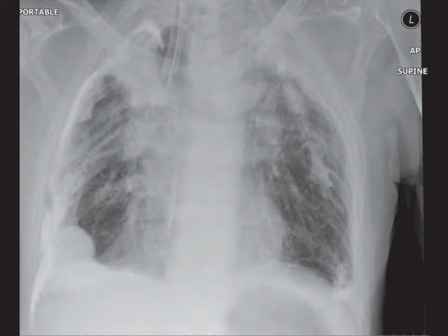Today, we're examining a rotated mobile supine radiograph of an adult patient. The patient is intubated, with the tip of the endotracheal tube visible over the distal trachea, just above the carina. I observe a shift of the entire mediastinum, including the trachea, towards the right, indicating volume loss in the right hemithorax. This shift is accompanied by extensive pleural calcification appearing almost confluent laterally and inferiorly on the right.